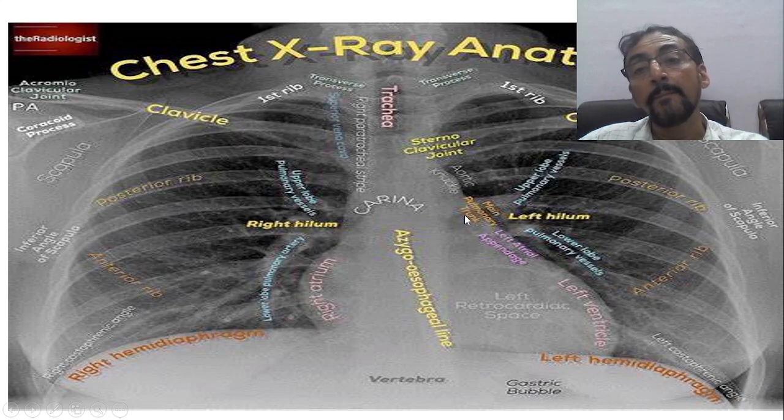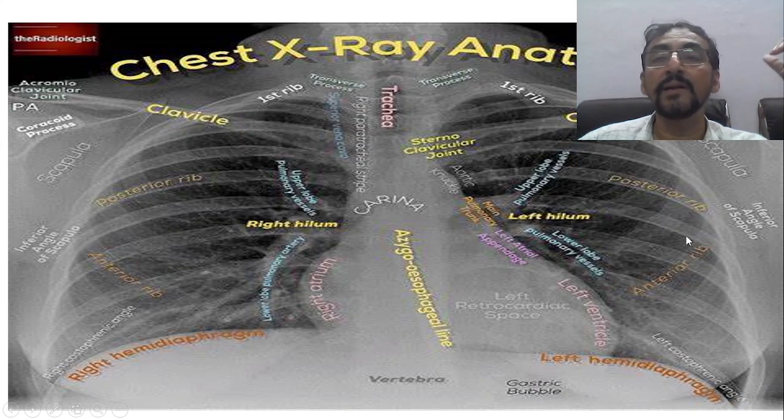Now this is pulmonary artery. MPV लिखा था, मैंने गलत बताया, MPA लिखा था. It is not medial pulmonary artery, this is main pulmonary artery. Okay, it's a mistake. It's not medial pulmonary artery. कहाँ पे होता है, नहीं है ना. So main pulmonary artery. Okay, main pulmonary artery. So this is aortic knuckle. Aortic knuckle का नीचे this portion is main pulmonary artery.